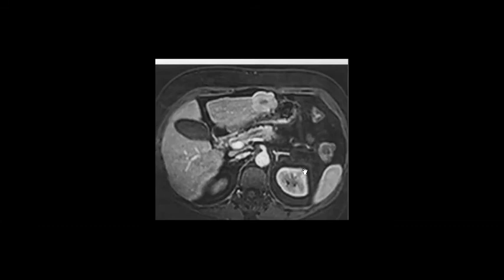In the MCQ and in all types of exams, you will find FNH. So I think everyone knows it. Just remember the difference from fibrolamellar. Usually it is larger than this one, more than 12 centimeters, and more heterogeneous in signal. The scar is usually low signal intensity in T2 if it is fibrolamellar. And you will also find multiple lymphadenopathy or invasion.